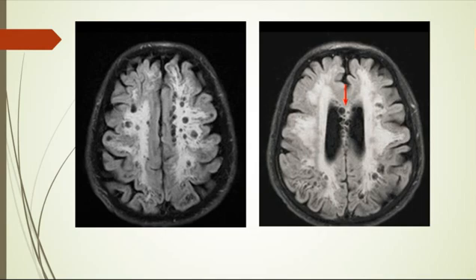The differential diagnosis includes, first, dilated Virchow-Robin spaces, exactly. Second, lacunar infarcts, like you said, and multiple sclerosis, where the burnt out lesion can show this appearance, and mucopolysaccharidosis, of course.